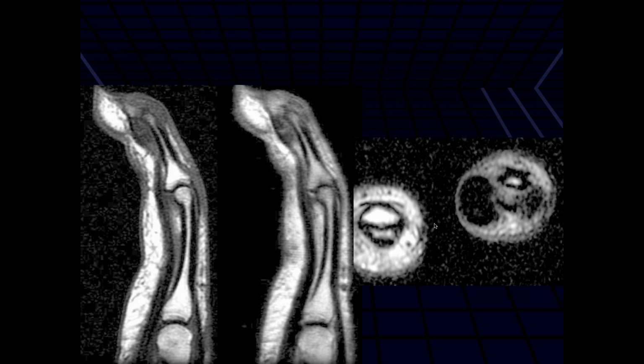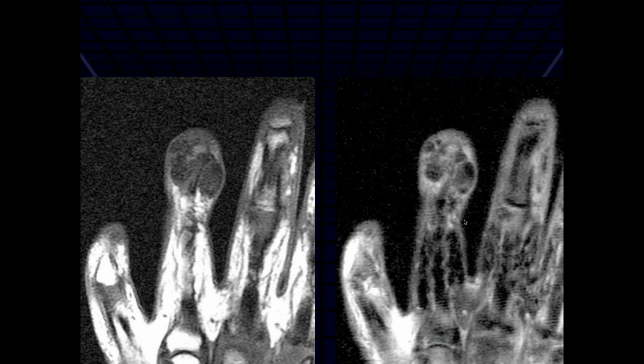It looks like it shows maybe better on the axial. At the very tip of the digit, there's a subcutaneous mass, where on the axial image it looks dark on that PD fat SAT image, I believe. So it looks like we got this fourth digit globular mass adjacent to the bone, but there's no obvious cortical destruction from that axial image that we had previously.